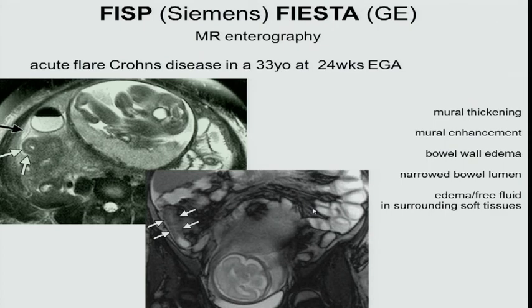So Crohn's is becoming more common in the population in general. So you have to think about something like this. Somebody's got abdominal pain. You've looked at the appendix, it's normal. You looked at the kidney, it's physiologic hydronephrosis. You looked at the gallbladder, there's no gallstones. You looked at the uterus, the baby's inside the uterus where it should be. So now you're looking at the bowel and you're like, well, there's fluid around the bowel and I've got mural thickening and mural edema. So it's in the part of the bowel that's near the cecum. So Crohn's would be a good differential for that.